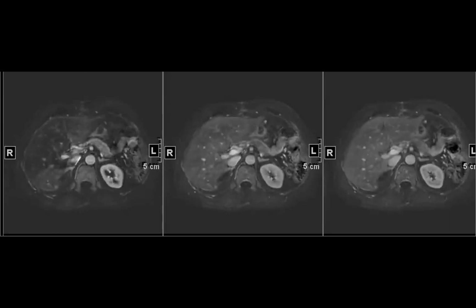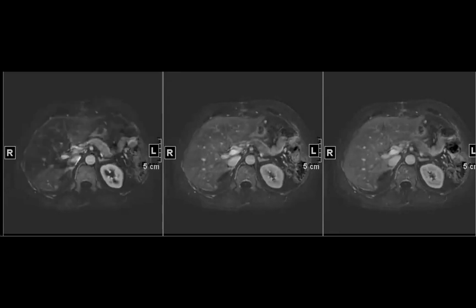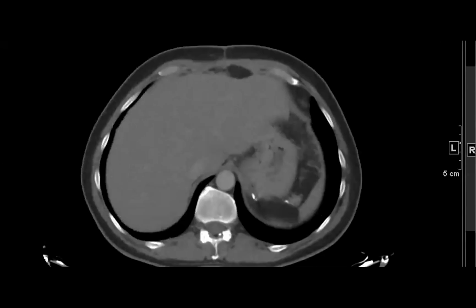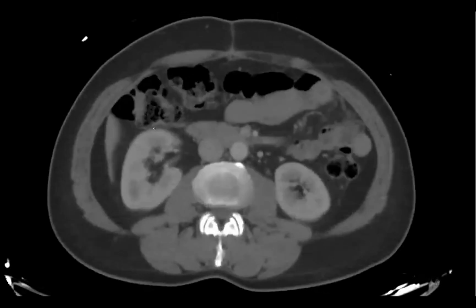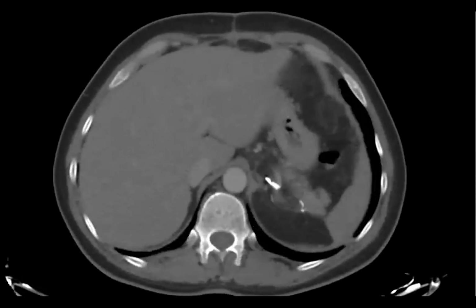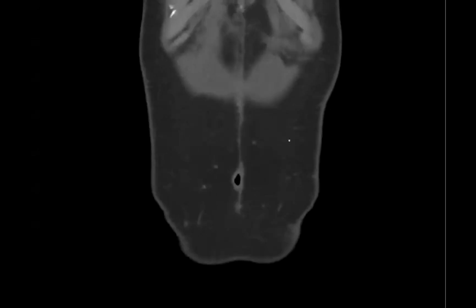Well, he never had an MR, and on CT, really there's nothing. But with CT, I would hesitate to say that they're definitely new, because CT may not necessarily detect such tiny things. But you can see that this thickening of the peritoneum and the capsule was not really apparent on the CT from early January, so like 2 months ago.